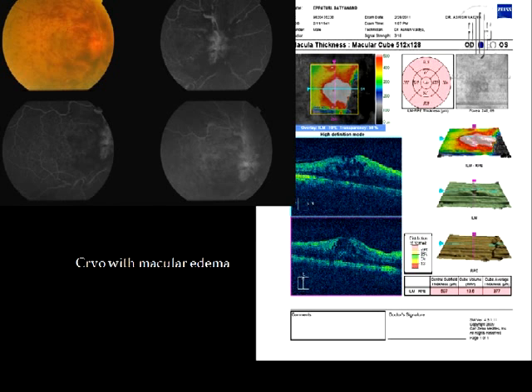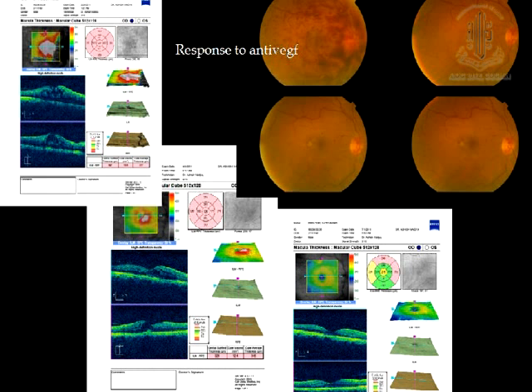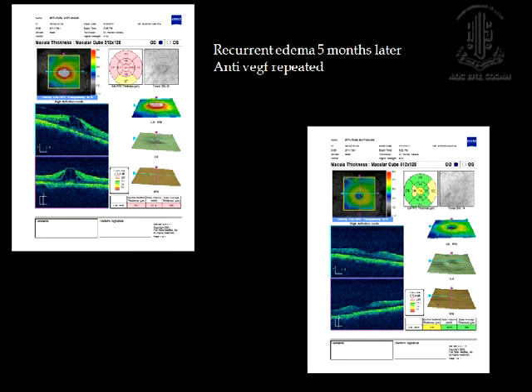We gave this patient anti-VEGF injections, and over the period of the next 4 months, you can see that this patient's vision steadily kept on improving. I also had a surprise. The patient's vision improved from 3/60 over here to 6/9 over here in the next 3 to 4 months. Then, on the 5th month, the patient had again a recurrence and the patient's vision dropped to 6/18. We gave one more anti-VEGF, and again the patient's contour was restored with a restoration of the vision.